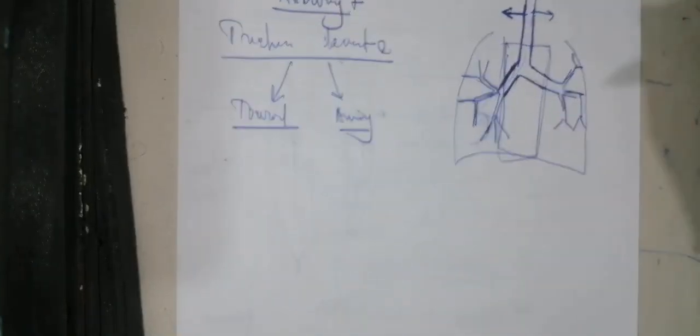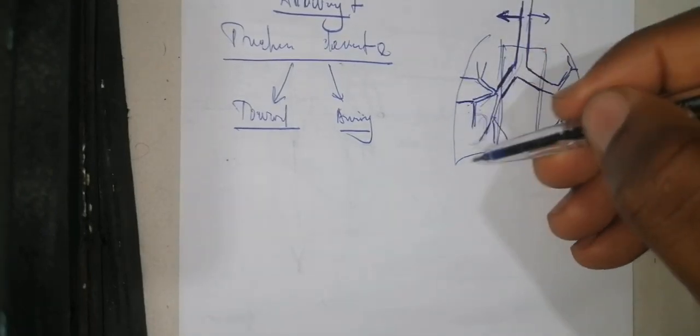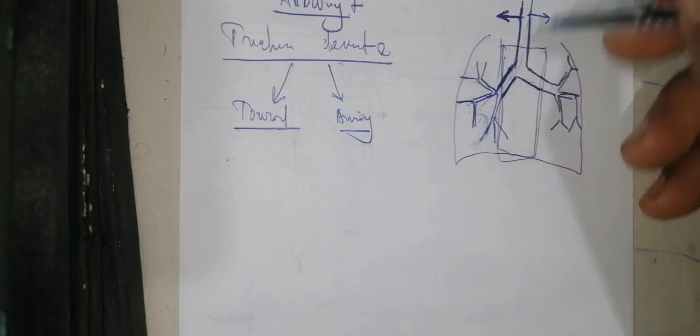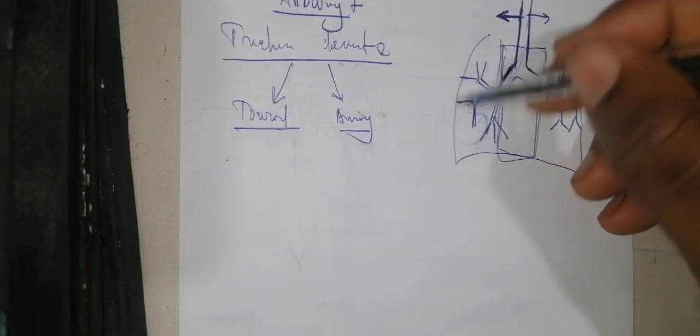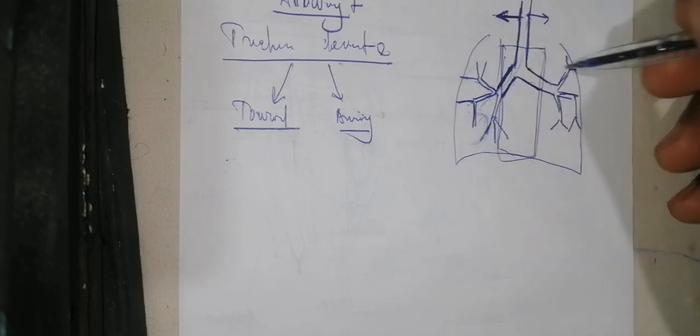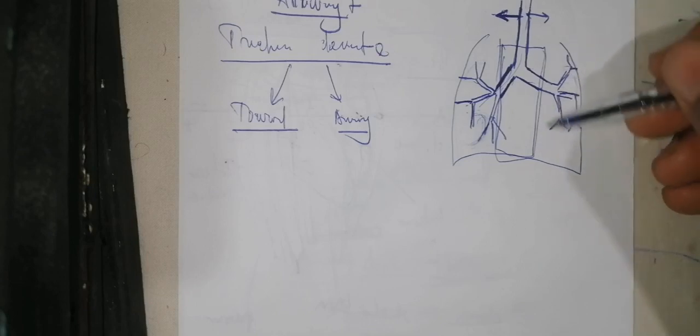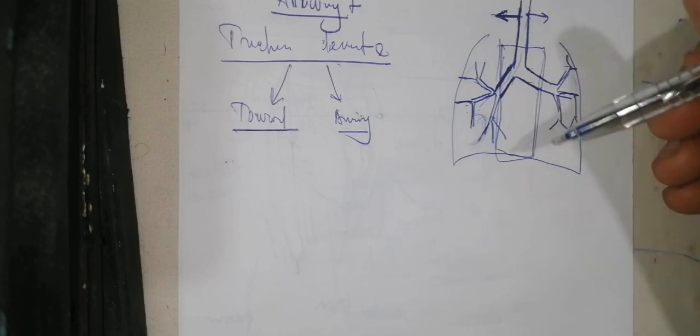If you see the trachea deviating here, and you look at the two lung fields and see there is a problem on this part here, it means that it's deviating toward the part that has the problem. Now, if the trachea deviates here and the problem is instead on the other side, it means that the trachea has deviated away from the affected side.